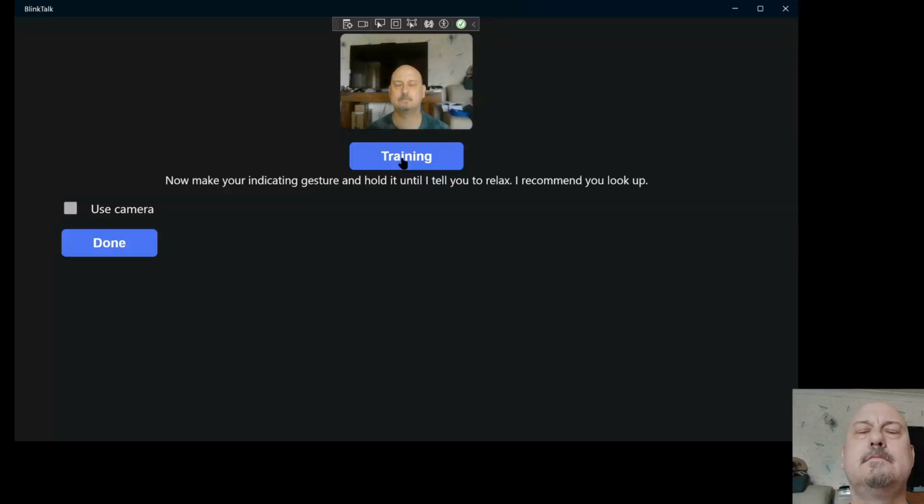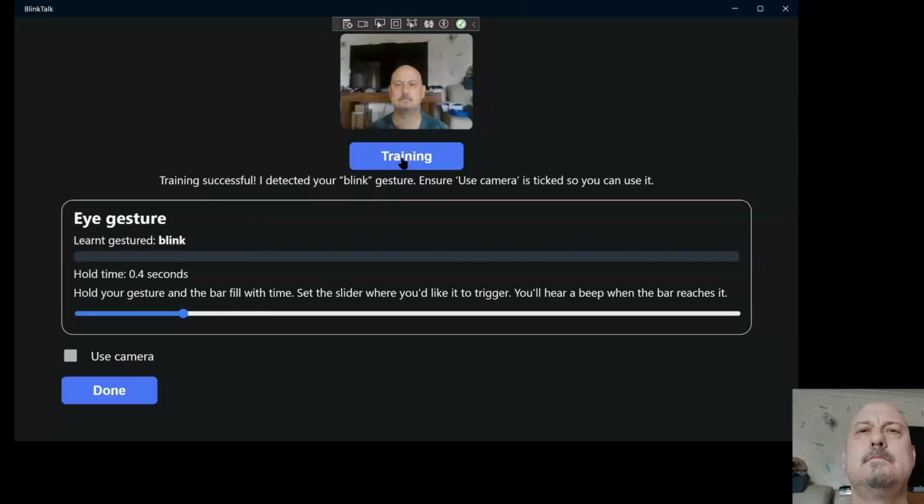Now make your indicating gesture and hold it until I tell you to relax. I recommend you look up. Now relax. Training successful. I detected your blink gesture. Ensure use camera is ticked so you can use it.